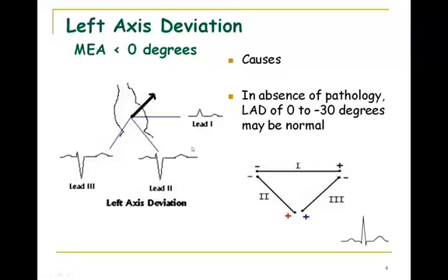So a big kind of flashing sign is, you're walking along, and I do this in lab, I'll walk along, look at someone's EKG and go, whoa. In lab, when we run the standard limb leads 1 and 3, if I see a lot of negative voltage in lead 3, I'm going, oh, might be a left axis deviation. And how do I know that? Because me saying it over and over to myself, well, yeah, after a while I remember it. But here's a way to remember. I want you to kind of understand it.